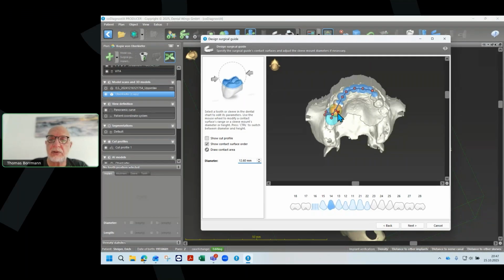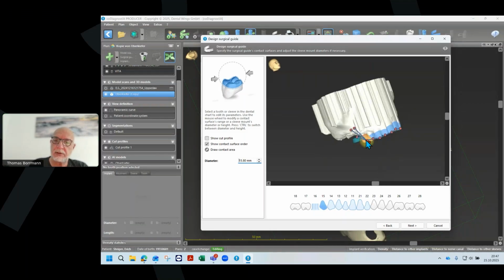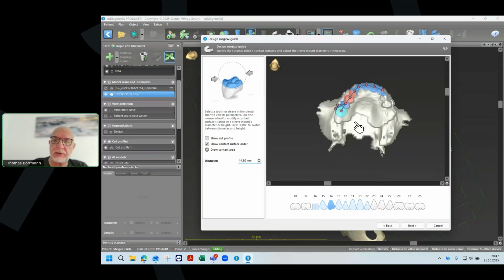This is 1, 4, 1, 5. Okay. See, that is a good connection here.